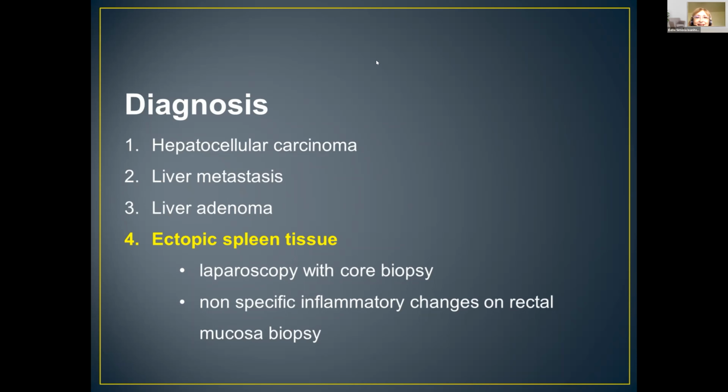Okay, the chat: hepatic enhancement is shorter. Yes, the hepatic enhancement is a little bit shorter than spleen. And what do you think now?